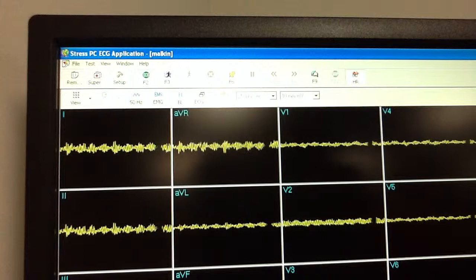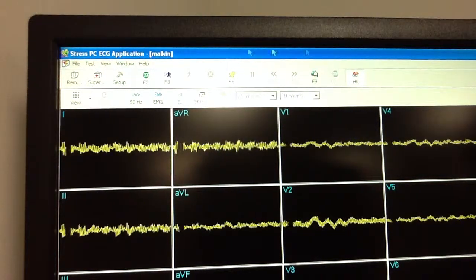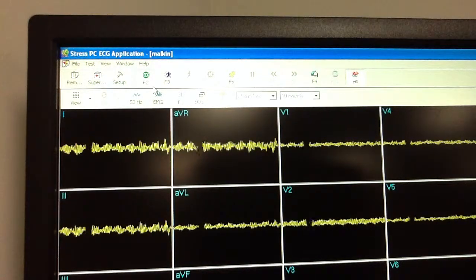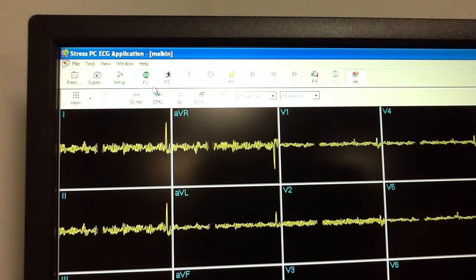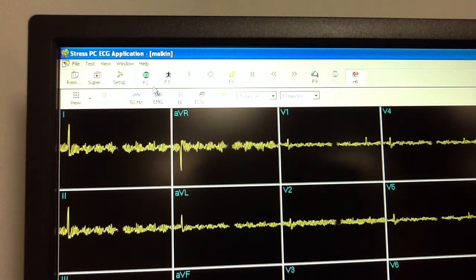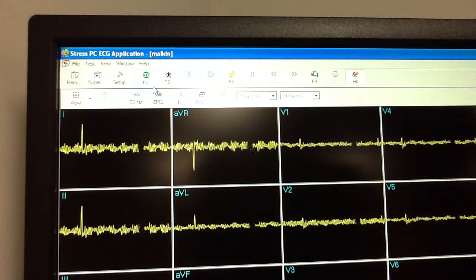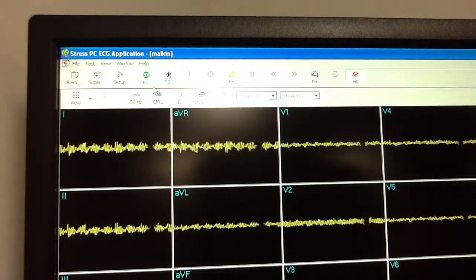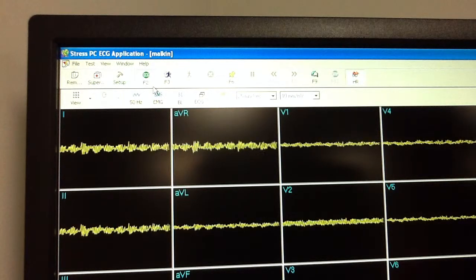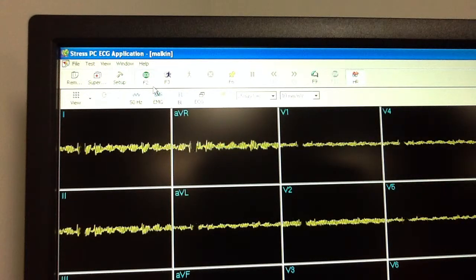And the first one that you're going to see, at the top, is the F2 button. And the F2 button is for monitoring. So when a client has leaded up and hooked up to the EKG monitor, this will take our resting measures during a particular protocol. So you might have a client whose measurements are taken in supine, seated, and standing position, and also a hyperventilation position.